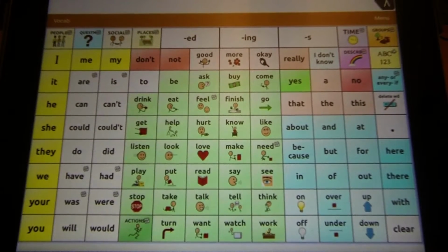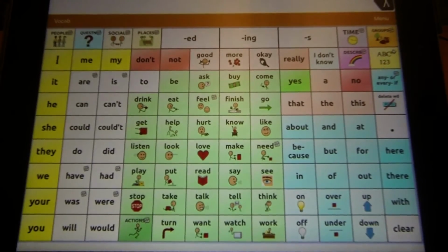As an AAC user, there are several rate enhancement strategies that can help you type faster and become a more effective natural communicator. One of these is called coding strategies, or known in this app as abbreviation expansion. First, let's show an example of one of these. Let's go to the keyboard.